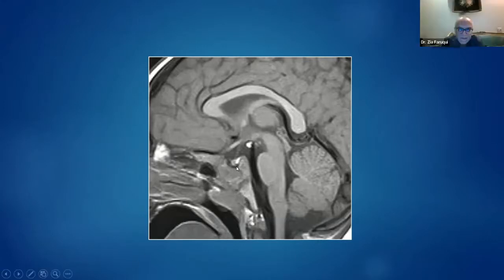Okay. So now we have the pituitary is normal, we have seen it for the anatomy. This is the anterior pituitary, the posterior pituitary, which I wanted you to show. This is the infundibular stalk. So there's one other pathology for which the scan was done. If anybody can pick it up, that's very good.